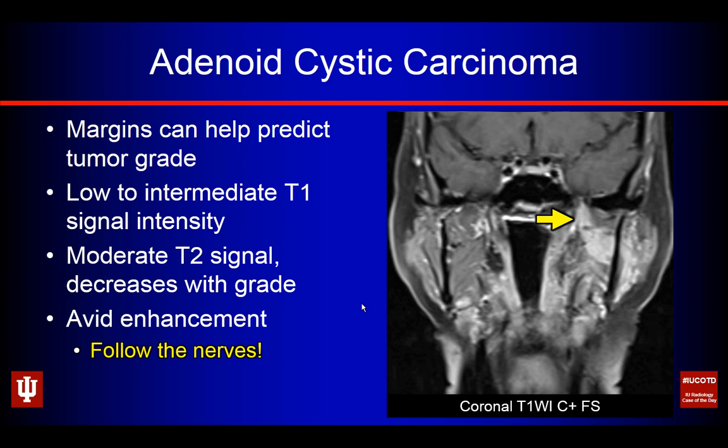And again, ADC map. It's imperfect, but it's a nice data point to look at. The lower the ADC, the more likely it is a cellular tumor. If it's a cellular tumor, it's more likely to be malignant than benign. Not a perfect cut point, but it's just another layer of icing on the cake of trying to come up with the diagnosis.